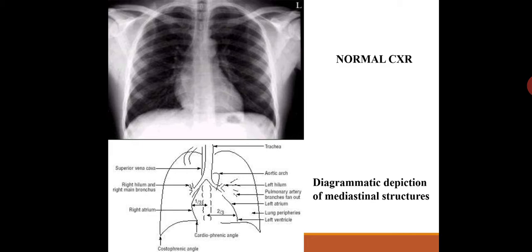So, this is a normal chest X-ray and a diagrammatic depiction of mediastinal structures.